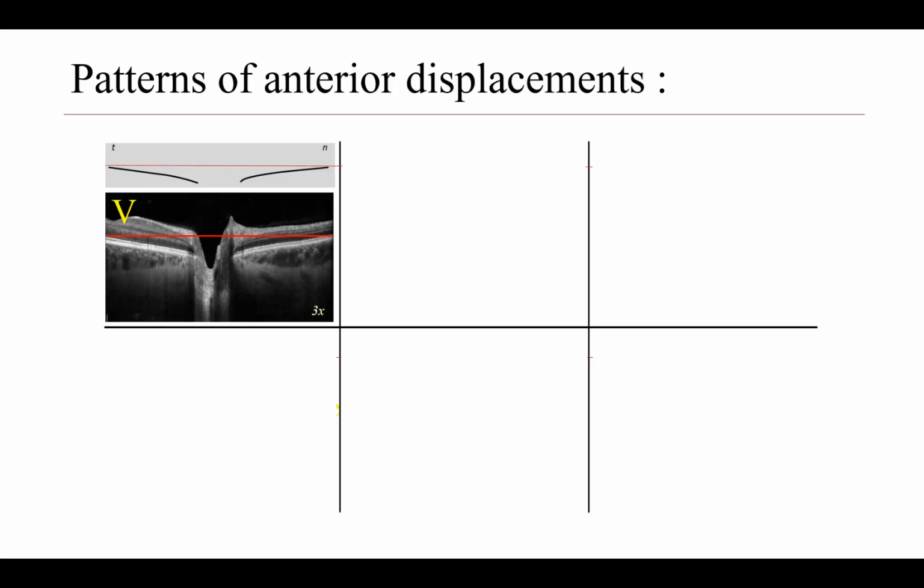This is an oversimplified description of the configuration, and it's all described relative to a horizontal line placed at the RPE basement membrane layer at each edge of the image, assuming that the basement membrane opening, the BMO, is centered in your slide and the image is flat, to describe the shape of the RPE basement membrane layer relative to this red line. I've identified 6 basic patterns.